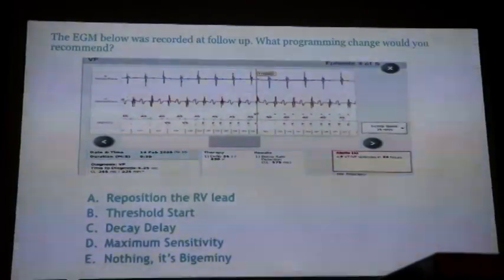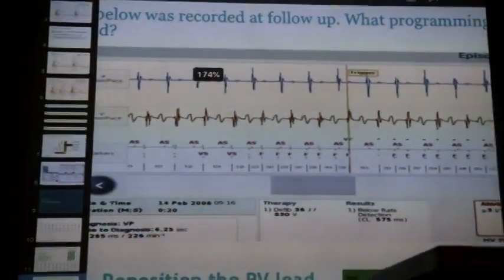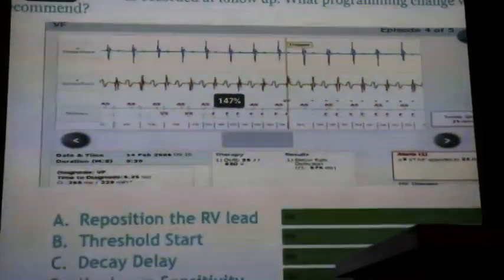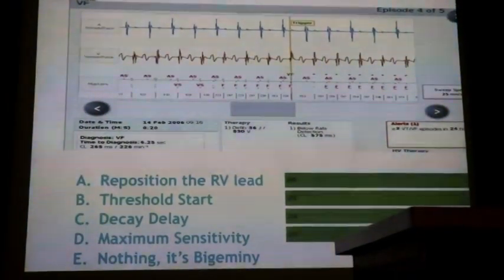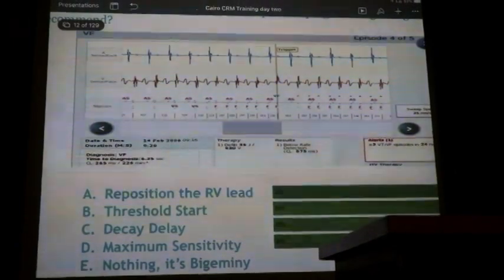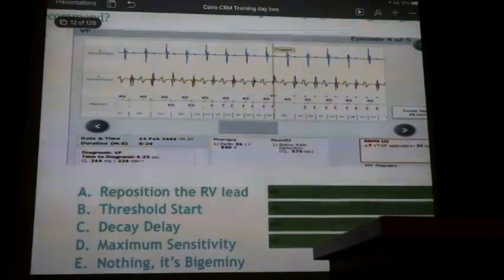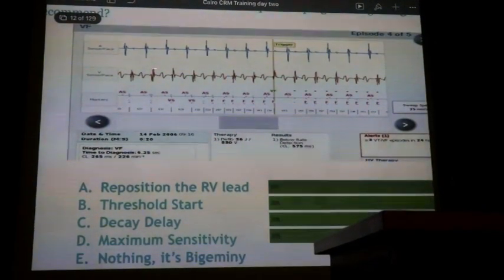Okay, what about this one here? Let's zoom in. So here, ignore the kind of question, we'll just look at the electrogram. Ventricular electrogram, atrial electrogram. What is your issue? He's sensing the P waves. Sorry. No. Walk through it.